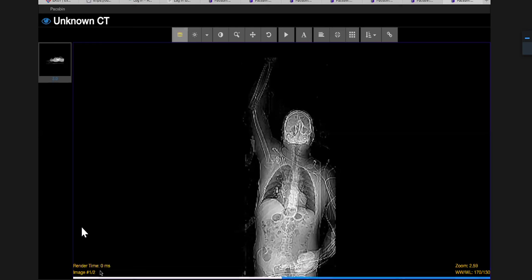So again, you may get shown something like this, and this is kind of thinking outside the box a little bit. It's like, what's unusual about this patient? Why would they look like this going through the scanner? It's because he can't put his arm down. And you can make that diagnosis off the scout, which is quite good, isn't it?